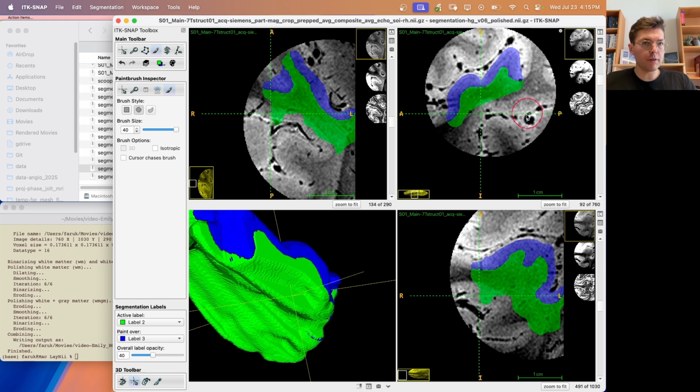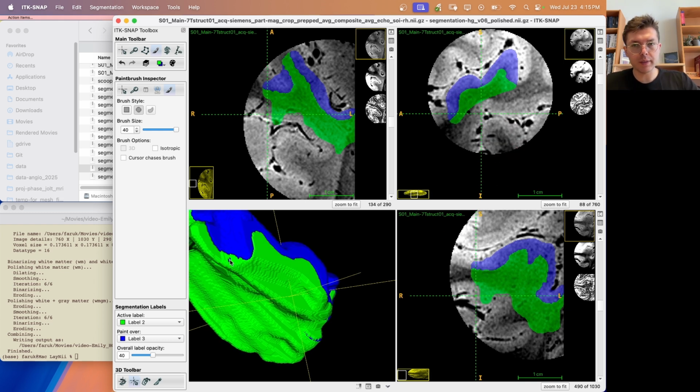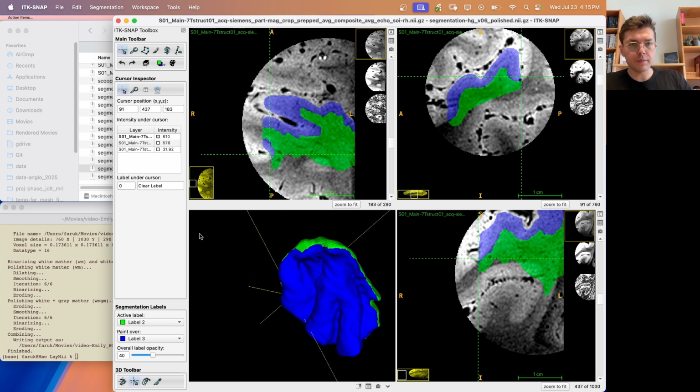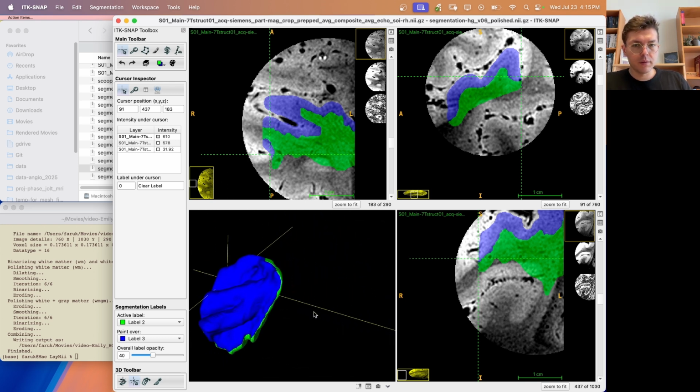Then basically, we should start with these 2 and 3s already in the rim format, not 1 and 2 as I was doing with the red. Okay. Well, this is pretty good. As you see, it's getting there.